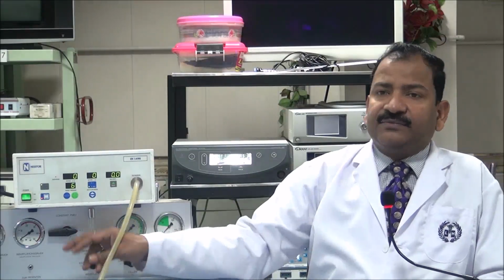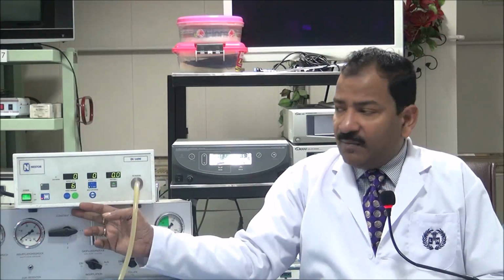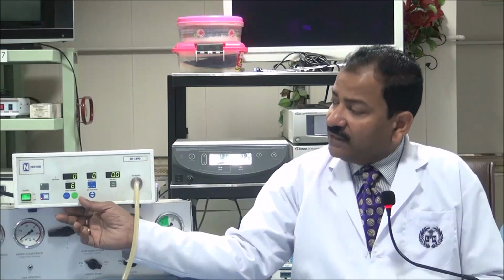Preset pressure: initially you should set the preset pressure. Suppose you want to do thoracoscopy, then it should be 6. Generally in thoracoscopy, it is not good to put gas inside the chest. It is not necessary. But if you have to put it, a maximum of 6 mm of mercury is required. If you are doing diagnostic laparoscopy under local anesthesia, then you should use a maximum pressure of 8 mm of mercury.